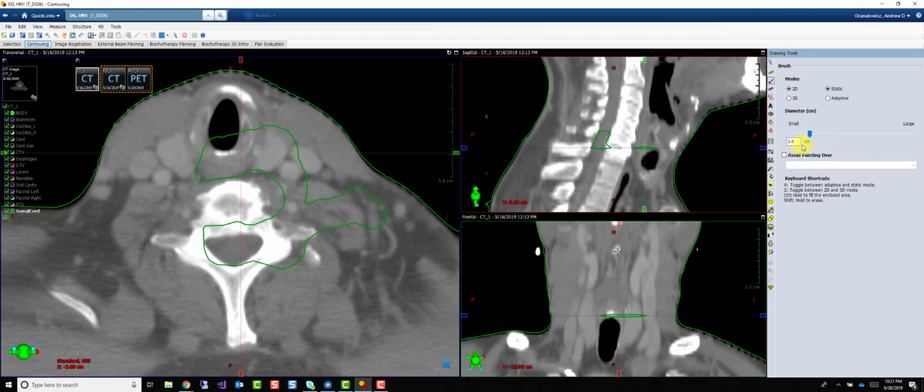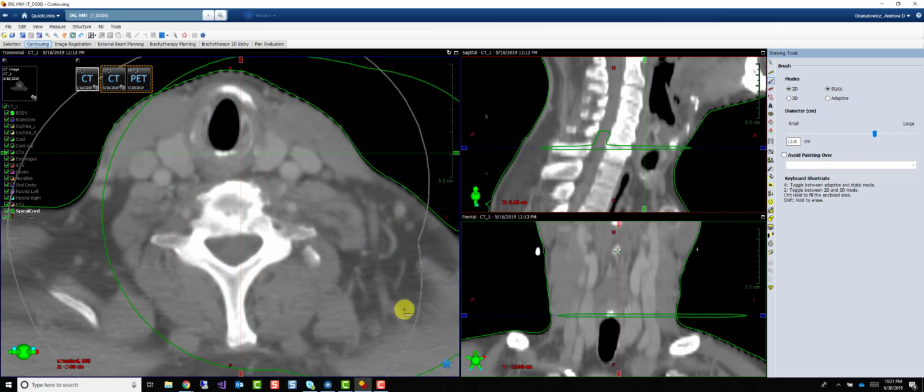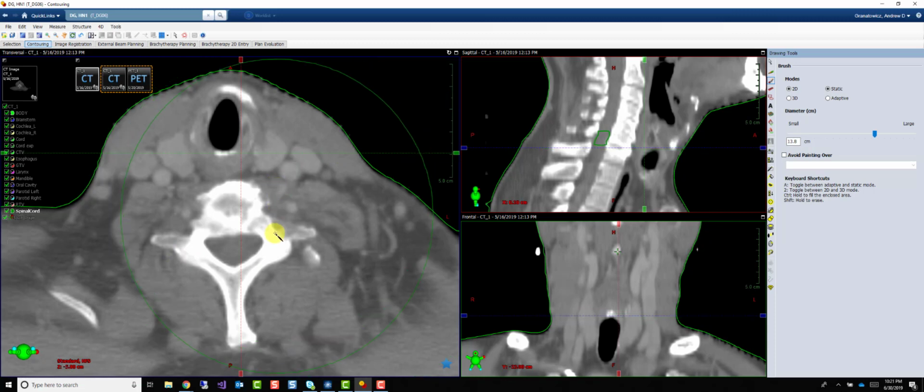To adjust the size of your brush, you can come over here and drag it around, or type in a size. If you want something like, say, exactly a 2 cm circle, type 2 cm. The other way is to right mouse click and hold it down and drag left to right. That'll also adjust the size. So if we want to erase all this, we can make it very big, and whoops, hold down my shift key, erase everything.